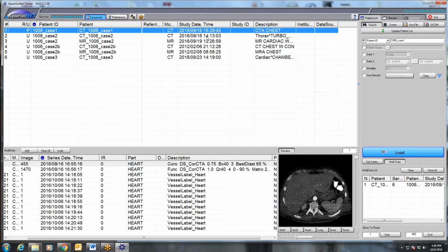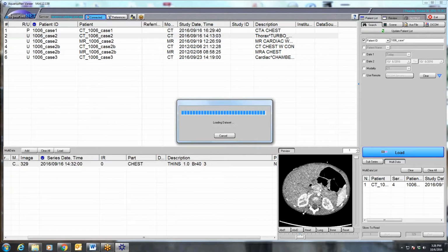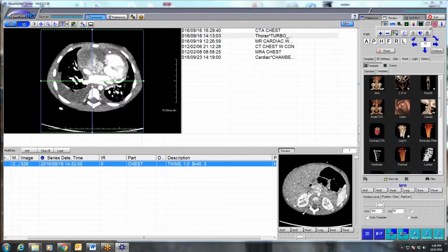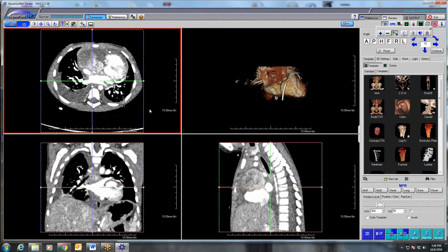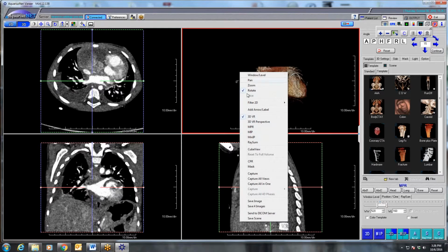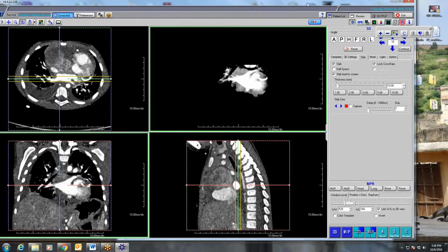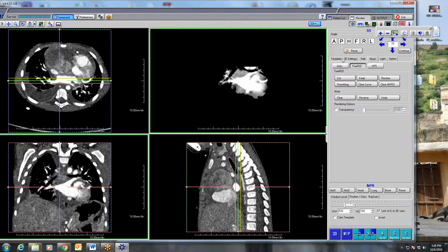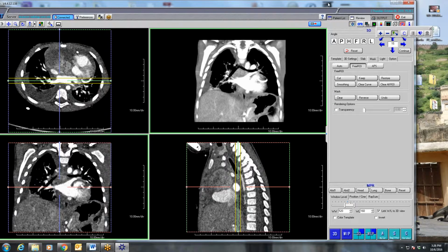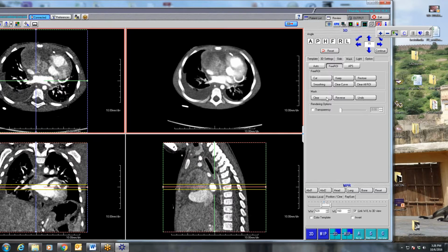Great. So this was an interesting case we had before I went away. Let me kind of thicken this thing up so I get a little more, move over out of the way, a little less noise here. Let me do this. Sorry.